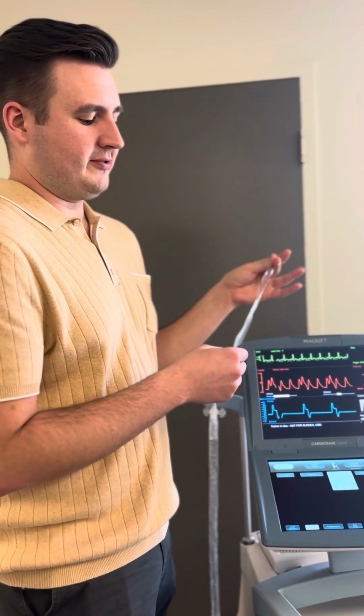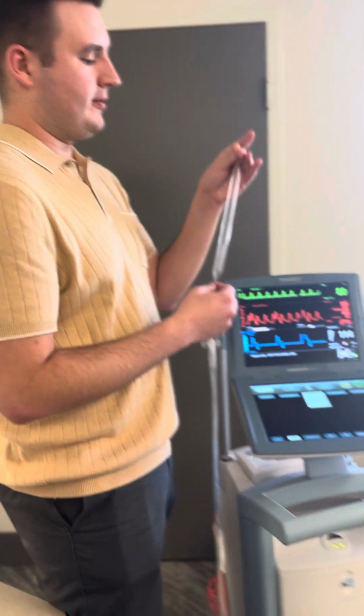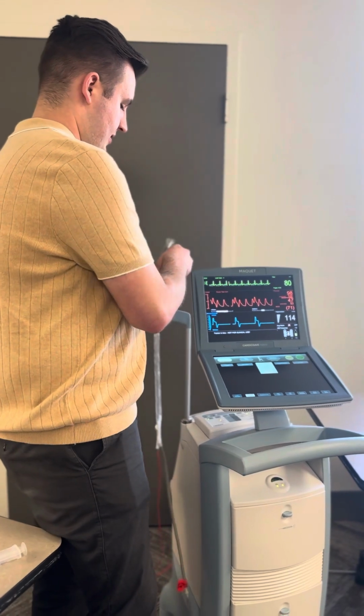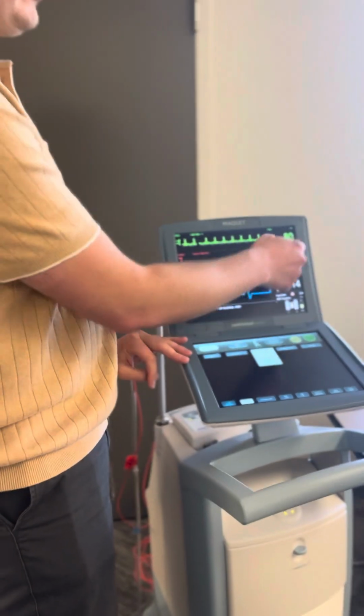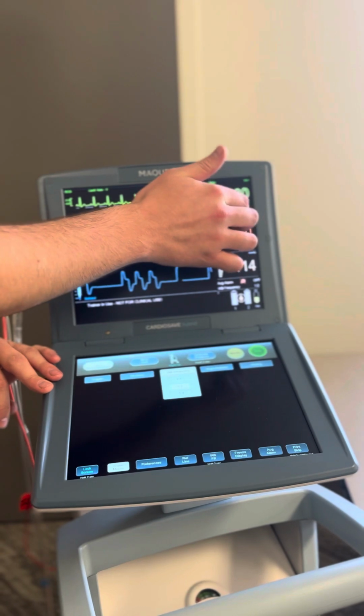Mostly when we get a patient from cath lab, they're going to be in 1-to-1 because they need the most help. But the 1-to-3 will be like we're trying to get them off, and we're seeing how well they do. And so you notice when we do anything but 1-to-1, so in 1-to-1 there's a blood pressure, but if you go to 1-to-2, now we have some extra numbers.